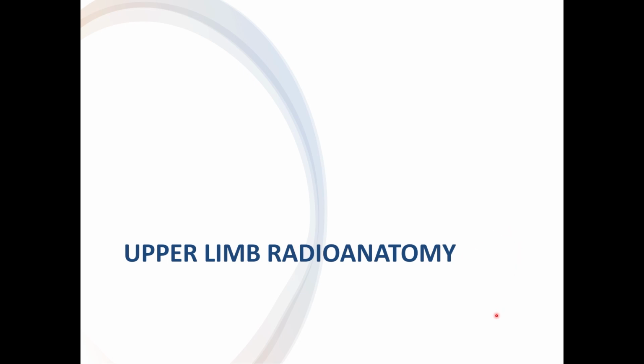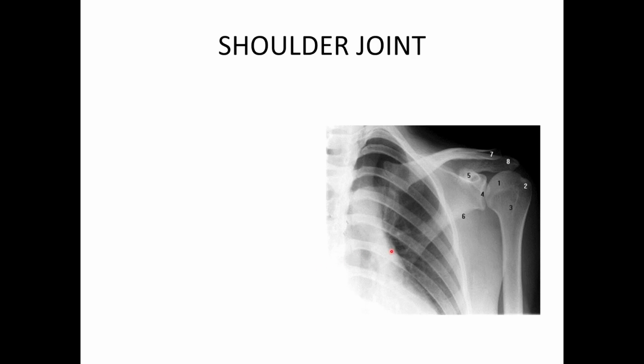Hello everyone, today we're gonna review the upper limb radioanatomy. First we have a shoulder joint. This modality is a plain X-ray and the view is anterior posterior.